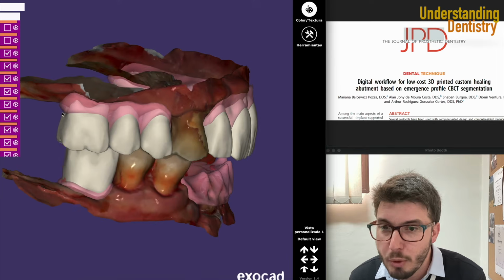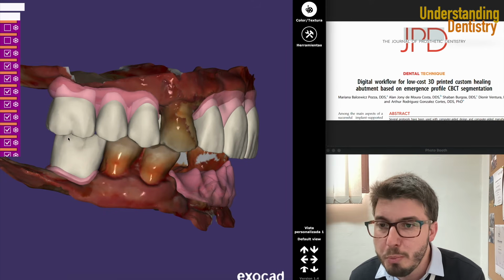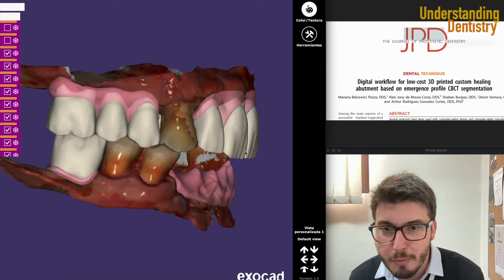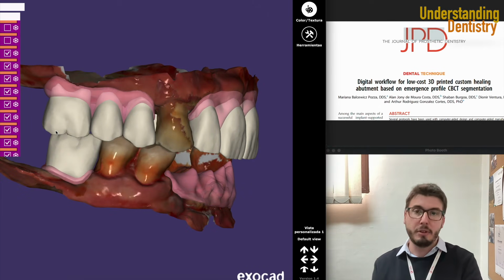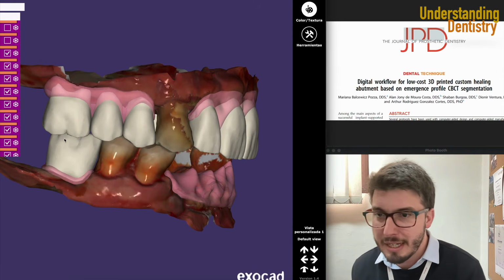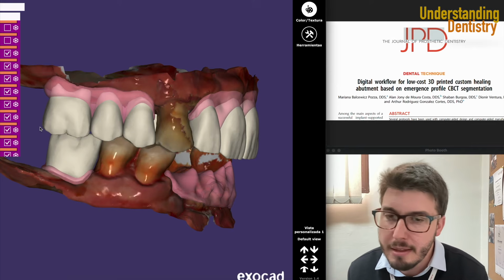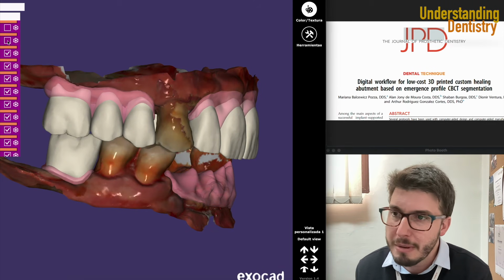Now the lower molar, and then we have a very nice curve of Spee. Take a look at this curve of Spee, which will prevent a lot of issues from happening. And that's the curve that we are talking about. So it's an ascending curve from a lateral view at the end of the cusps, so in the tip of the cusps of the teeth. Again, go back to the video of principles of occlusion, if you don't remember that.